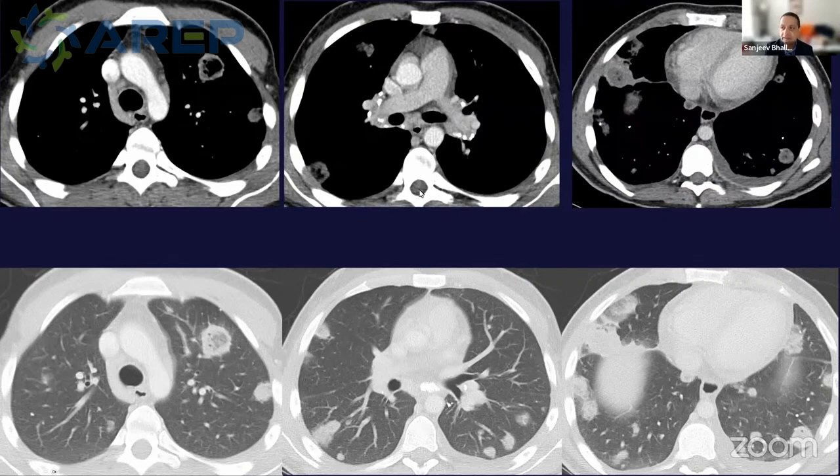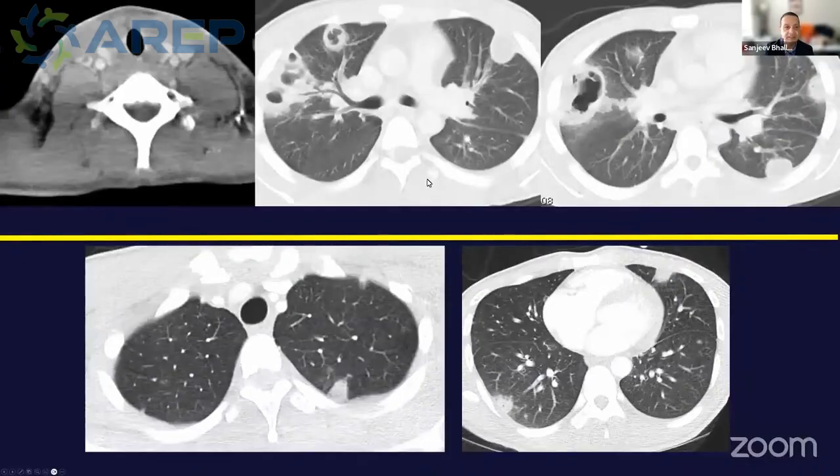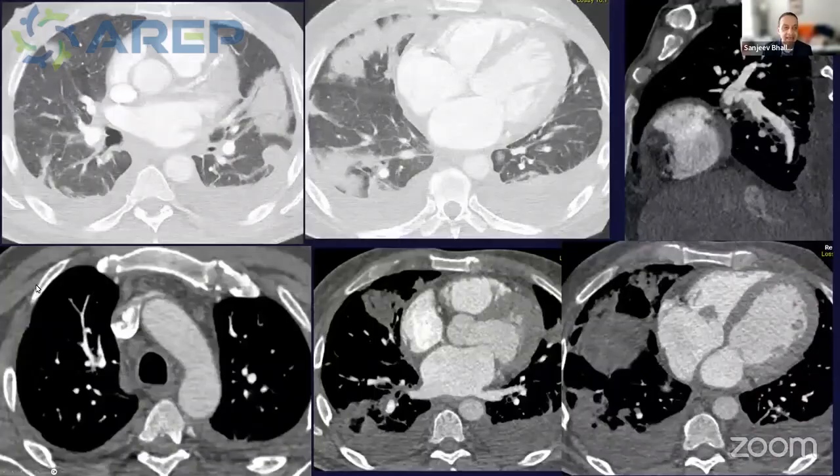In this patient, no filling defects were seen, but this person actually had a thrombophlebitis of the jugular vein, the so-called Lemierre syndrome, presenting with septic emboli. And just to share with you here examples, again, of septic emboli. A reminder that septic emboli really relies on the parenchymal findings, not the vascular findings. So useful, both of these patients, septic emboli, neither of these patients had filling defects in the pulmonary artery. Above the yellow line, this patient had a filling defect in the internal jugular vein, very typical of septic emboli.